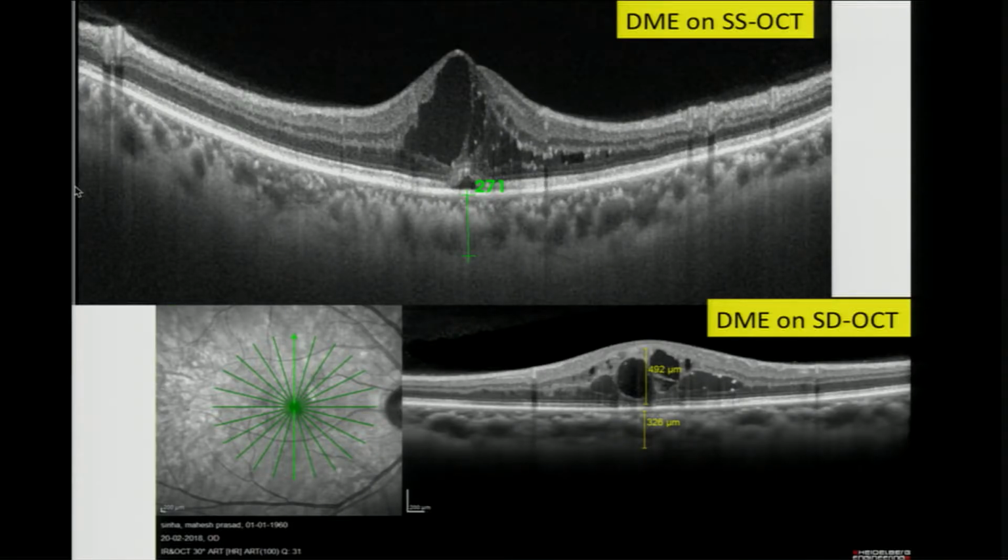And you can see here how stretched the vacuoles are in the foveal region. The vacuoles are stretched and they're pulling the retina vertically, and they're causing a destruction of the retinal architecture. And this is the kind of fluid which is causing internal architecture disruption and very severe loss of retinal tissue. Now these kind of cases are picked up very well.